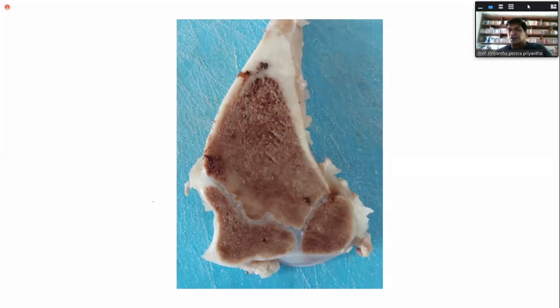So there is bulging of these ends of the bone due to the accumulation of osteoid which is not mineralized, and that forms pressure on the metaphysis. The osteoid again applies pressure on the metaphysis, so the metaphysis becomes cup shaped. With pressure again, the ends of the bones get spread outwards.